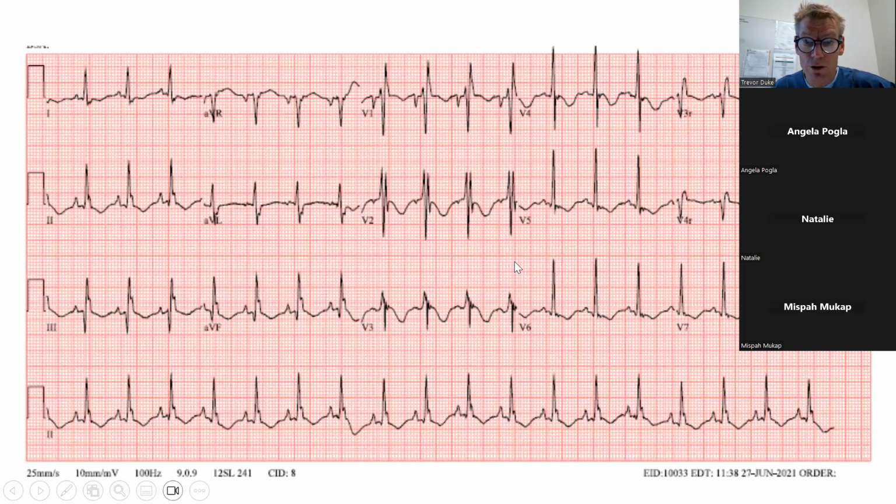Okay. All right. Well, that's most of learning about reading the ECG, the things that I've just mentioned. But I want to show some examples now of some ECGs, and maybe we can go through some.